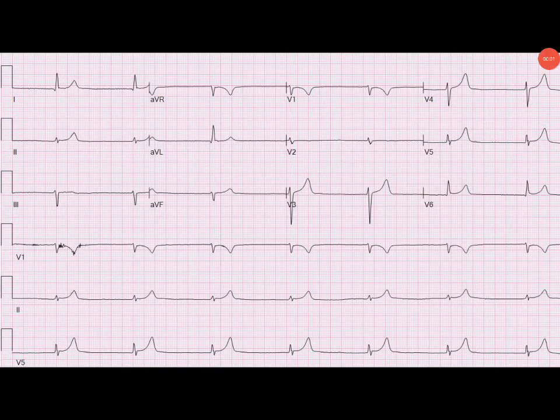I wanted to make a video to talk about some junctional rhythms. So let's take a look at this one. First things first, the rate. Just by eyeballing it, we know that it is slow.